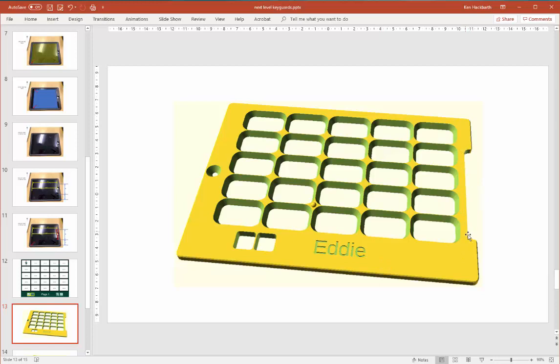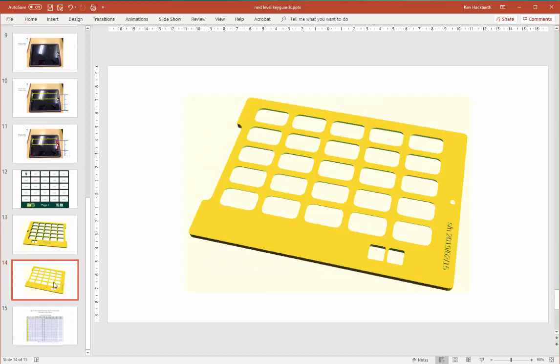We wanted to account for the place where that extra plastic from the case limited our design, so we couldn't simply go with a rounded rectangle shape for our keyguard. And we're also going to put a serial number on the bottom of the keyguard. In this particular case, it's the date where the keyguard was specified, and that might be how we keep track of all of our keyguards, is the date that we specified them.